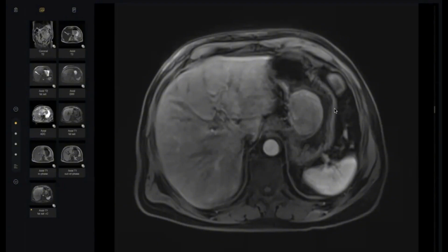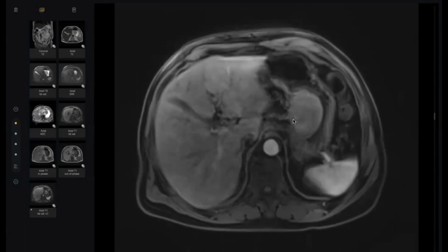Sometimes the GIST may be exophytic. Sometimes it may have some ulceration, but no aggressive signs. This is GIST. One of the common sites is the stomach. What is the other most common site?